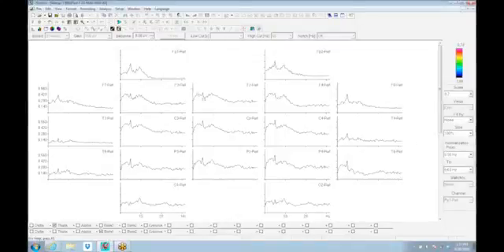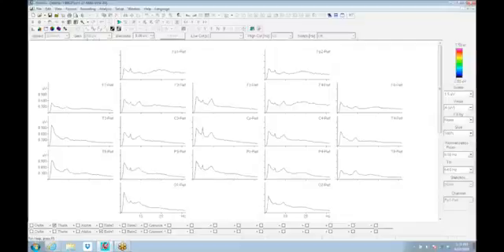With hypercoherence in alpha frontally, you end up seeing a real big peak in alpha, and you'd see the mapping of all the alpha being high frontally. Biofeedback doesn't work in those areas. It works primarily in the raw spectra through the Fourier.